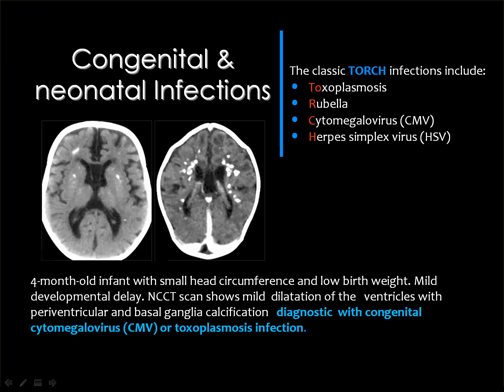These infections will result in intracranial calcifications that are distributed in the periventricular region, haphazardly distributed. And trying to diagnose one of these specifically is not possible. If you see multiple periventricular calcific foci, then you say that this is periventricular calcification diagnostic of congenital intracranial infection.